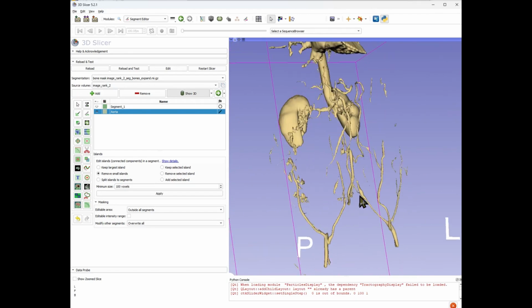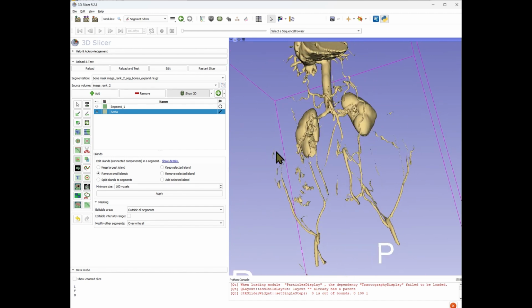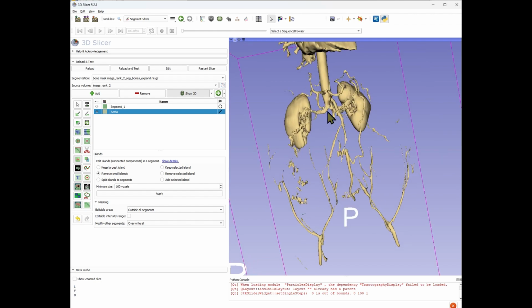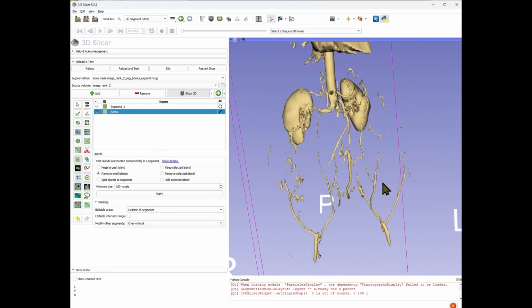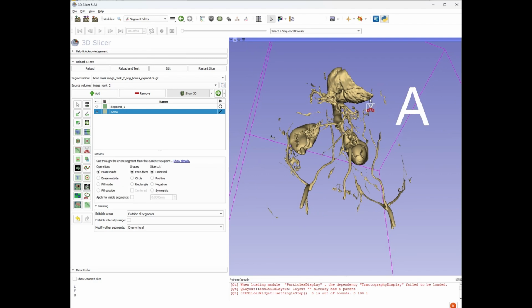Alright, so now you see that here's the aorta, and then here's the common femoral artery. There's a missing piece here. So your job is to finish creating that. Actually, let's remove the rest of the heart here. This is kind of annoying.